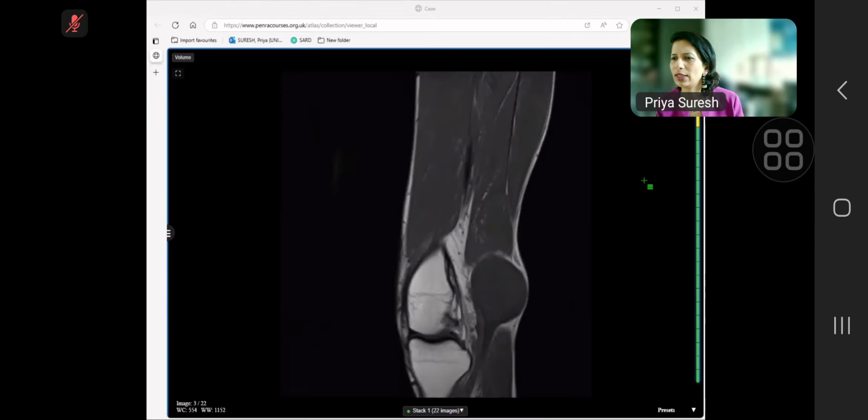Could you show the image? Yes. No, it contains a few. It is a low intensity lesion with internal areas of necrosis. There is no definite muscular infiltration seen. I would like to see the post-contrast images and T2 and STIR weighted images for further evaluation of this lesion.